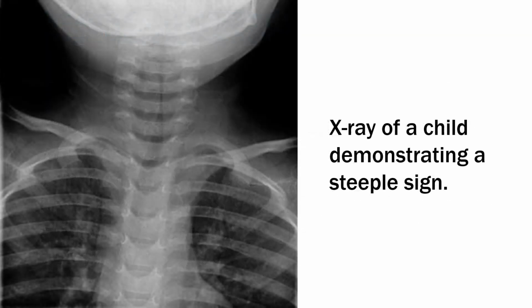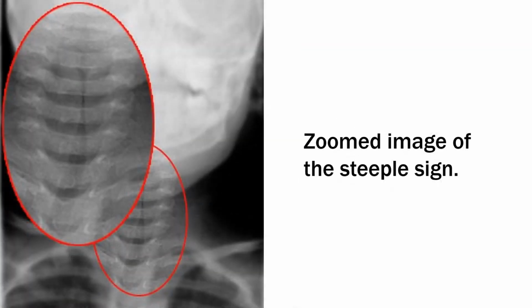This is an X-ray of a child demonstrating a steeple sign. Here you can see the zoomed image of the steeple sign.